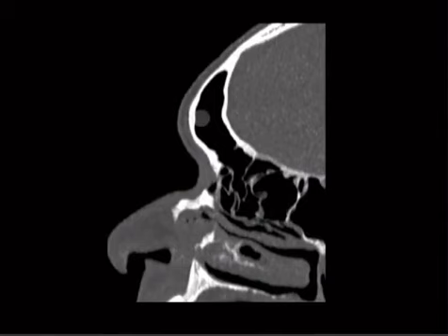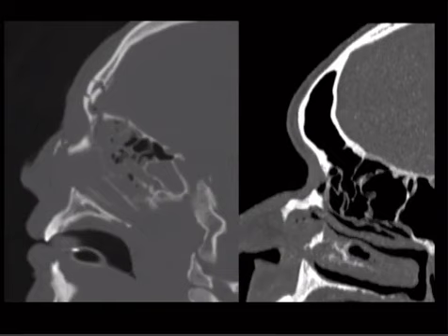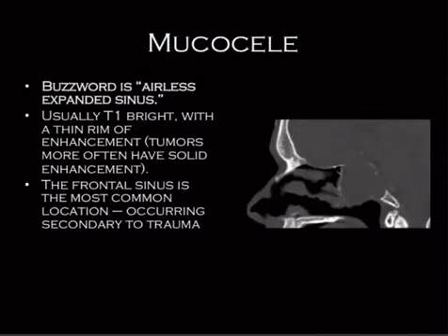Here's your frontal sinus draining into your ethmoid sinus, and it drains through a little passageway right there, which some people call the frontal ethmoid recess. If you imagine that in this setting, where somebody's had their face crushed and that passageway disrupted, it's going to later affect your ability to drain your frontal sinus. If you can't drain the mucus out of your frontal sinus, then you end up with a mucocele.